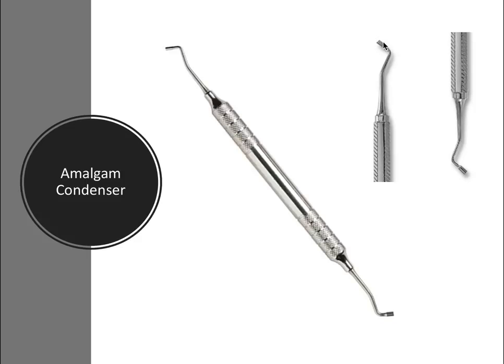So the nib of this instrument is the portion of the condensing instrument that comes into contact with the restorative material being condensed. And the very end of the nib is called the face, and it's usually smoothed but can be serrated.